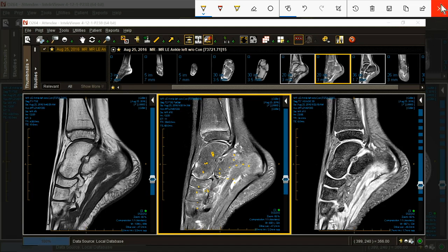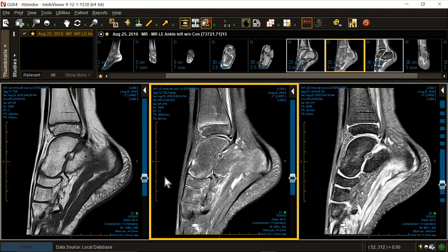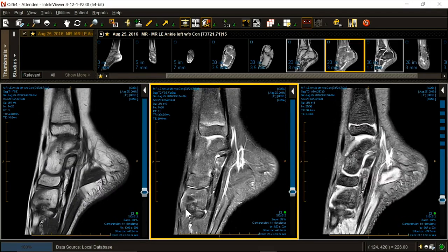But should you have edema that is peripherally based, patchy but subcortical, in almost every bone, you've got complex regional pain syndrome type 1. Type 2 is when you have a nerve injury. And this is a critical diagnosis to make.